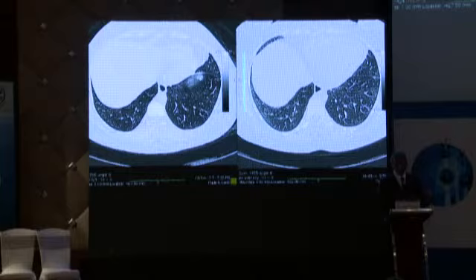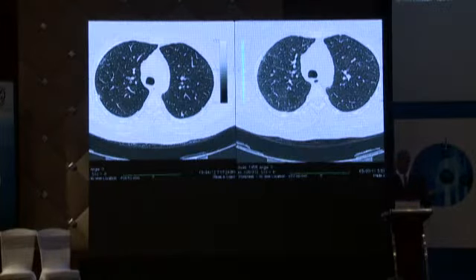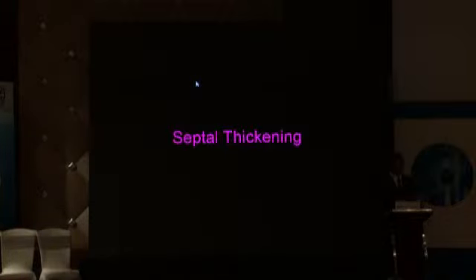And you can see a patient here of rheumatoid arthritis who has very, very subtle disease. A year later, the disease is pretty much unrecognizable. And you can see that in the upper lobes as well. If I didn't know that the patient had presented with subtle NSIP pattern, I would have probably called the scan normal. And that's what can happen with the NSIP pattern. So that's 70% of all ILDs, UIP, IPF, and NSIP. And then we move on to the other conditions.